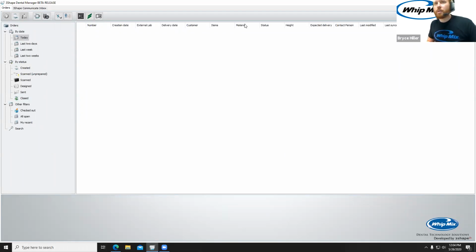All right, so I've got a scan for a partial on my desktop, so we're going to go over the order form, then import the scan and jump into the design. Also, if anybody has any questions at any point, type them in, and Cory will probably be fielding those as we go.